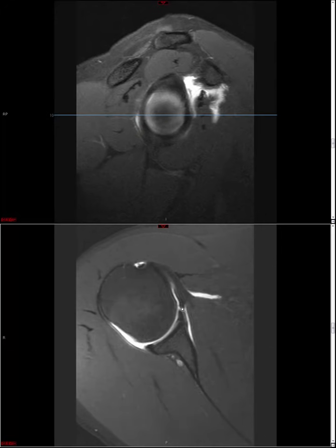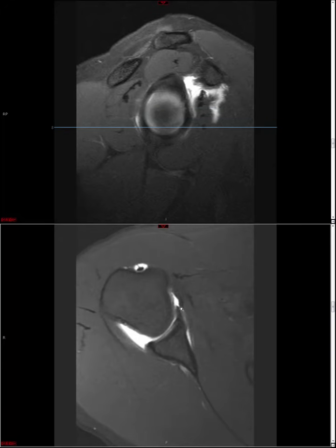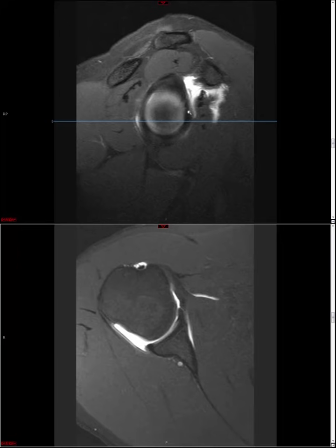So a Bankart lesion is basically a disruption of the labrum at the attachment point of the anterior band of the inferior glenohumeral ligament, and we'll leave for another lecture the alphabet soup of all the different Bankart type lesions that one may encounter. You may see disruption of the ligament from the humeral attachment, a so-called humeral avulsion of the glenohumeral ligament, and so on and so forth. So you can see as I go through this how critical this 3 to 6 o'clock region is.